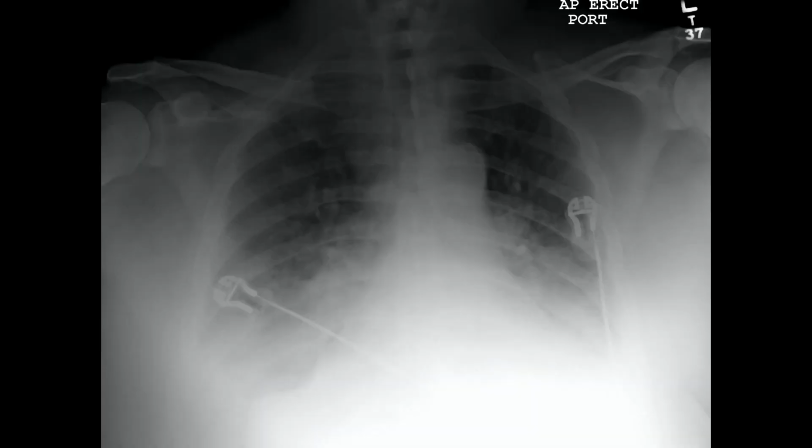And so here's the patient's x-ray, right? You get the obligatory x-ray, and the radiology read is they have some opacities in the bases. It could be a number of things. It could be atelectasis, could be effusion, could be infection. You guys figure it out, right? We're just telling you that it's there. Your job as clinicians is to figure out what's going on. So that's decently helpful, but pretty unhelpful when there's a large differential to continue to weed through.